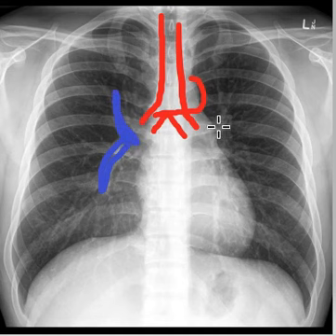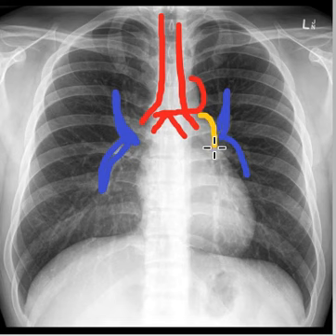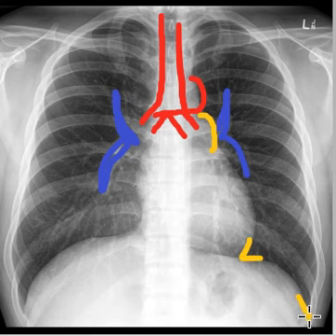Now in this hilum, you have the pulmonary arteries and veins present over here. This thing over here, which is right beneath the aortic knob, is the pulmonary artery. And then you have the left heart. This is known as the cardiophrenic angle, and this is the costophrenic angle, both sides.